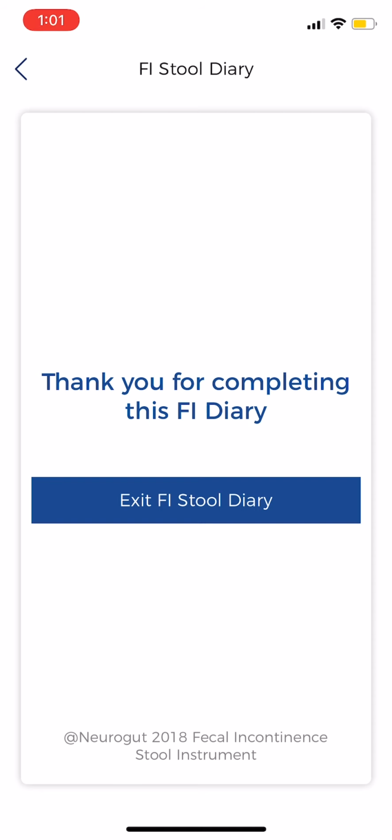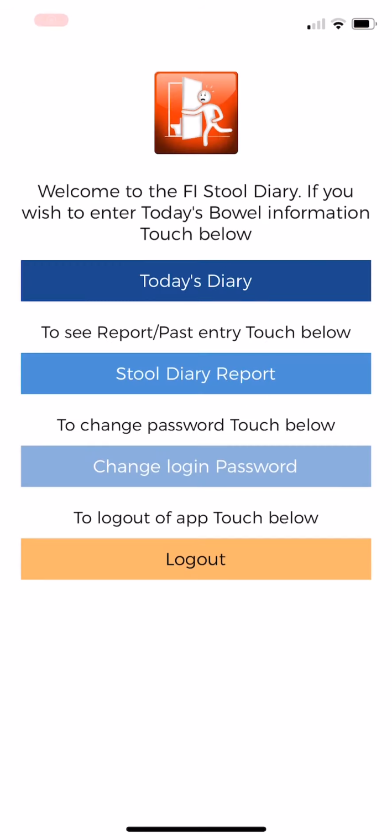Congratulations, this is the last screen. You have successfully completed all entries for the FI Stool Diary. Go ahead and exit the Stool Diary by pressing Exit Stool Diary.